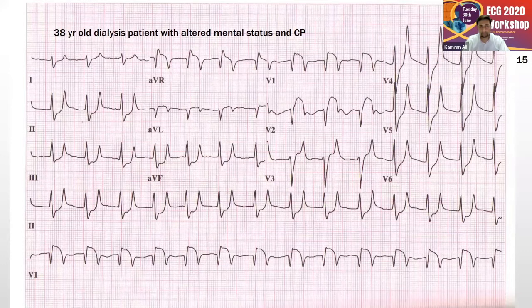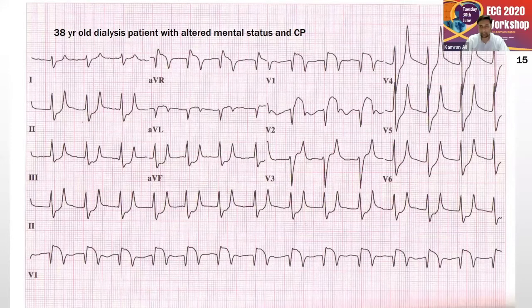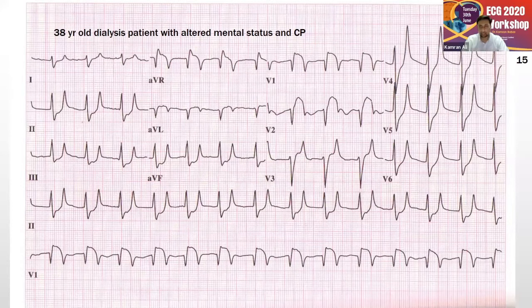All right, so you can see very marked ST changes that we are seeing. Good, peaked T waves, showing signs of hyperkalemia. And we know in dialysis patients, these things do happen. So hyperkalemia, that is correct.